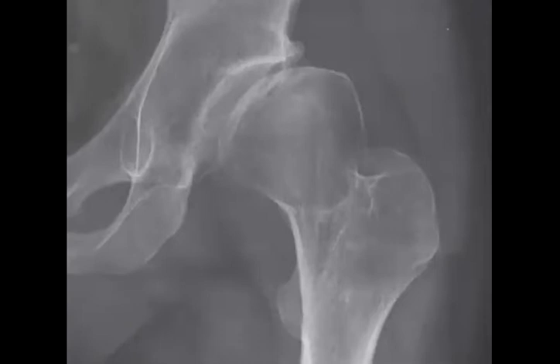It's not easy, but maybe. Do you see anything that is stable? And what about here?